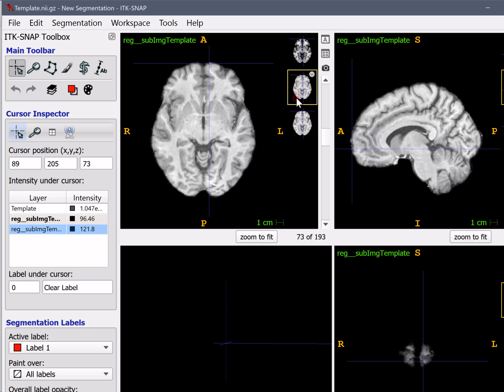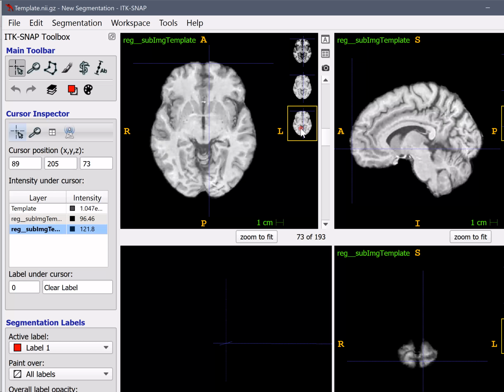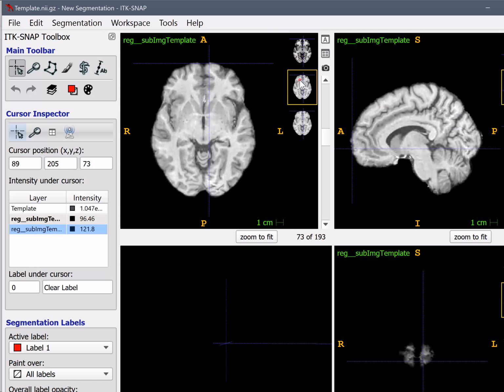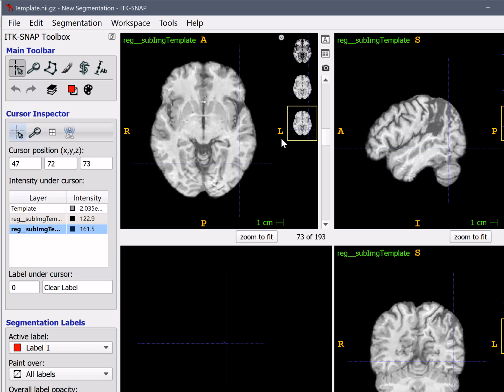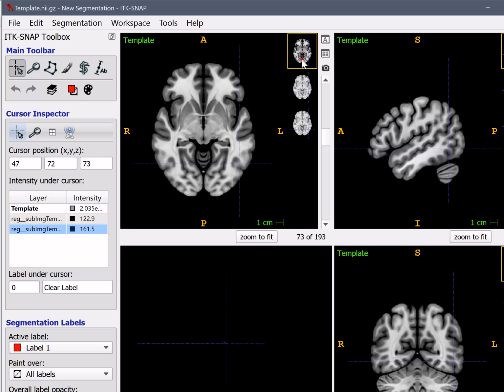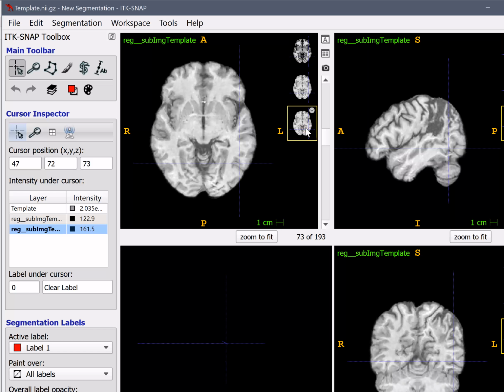And this change is pretty obvious here. By looping through 1, 2, and 3, you can try to understand which one is better. Let's focus on this specific area here. And if you loop here, the difference is a little more pronounced.